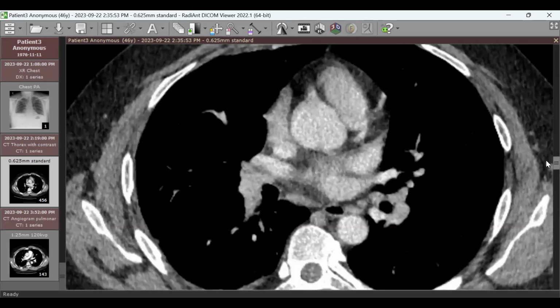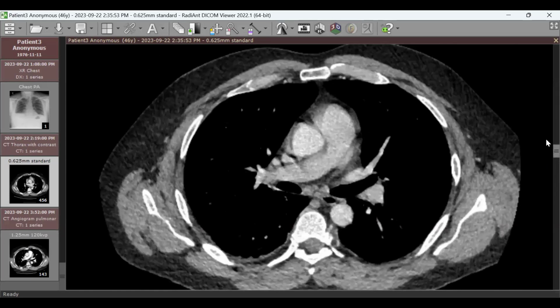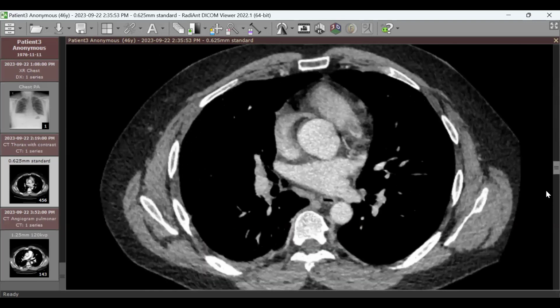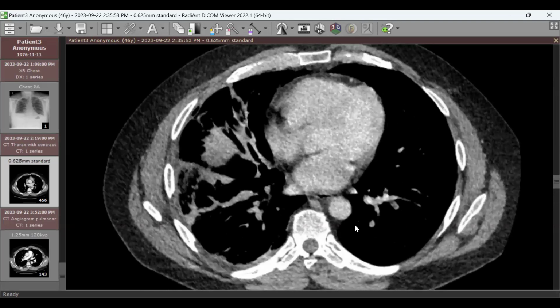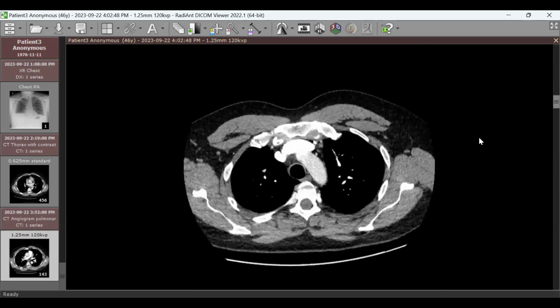Great. Of course, as you know, this is a CT chest with contrast. It is not a CTPA, right? So I reported this and mentioned all the changes. The remaining structures are not abnormal. But for proper evaluation of pulmonary embolism, we do CTPA, right? CTPA angio.